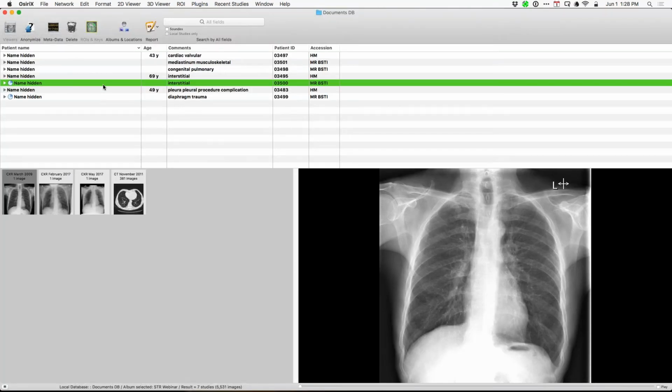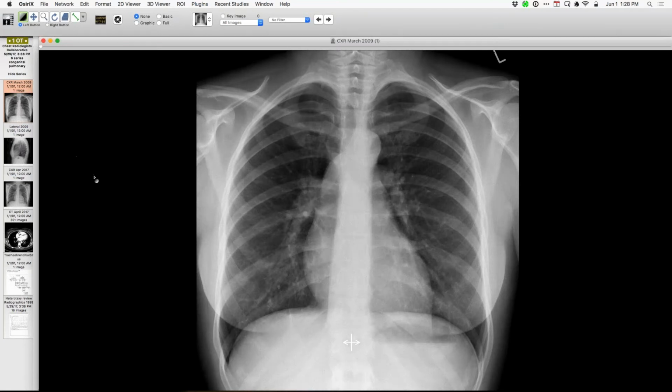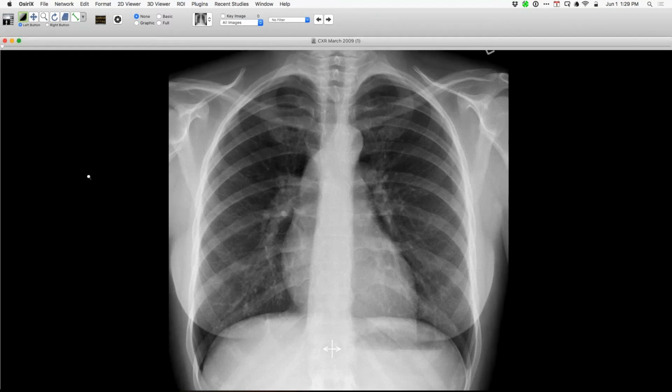Okay, let me show you this one. So let me bring up just the chest radiograph, and I'm going to intentionally hide the sidebar just for the moment and give everyone a moment just to look at this case and see how you would analyze this case. As you look at it, I will tell you that the findings that are present are not associated with symptoms as such, but just are some interesting imaging findings. So take a look at vessels in the lung, vessels in the mediastinum, and other interfaces. It's kind of acute cases you'll see.